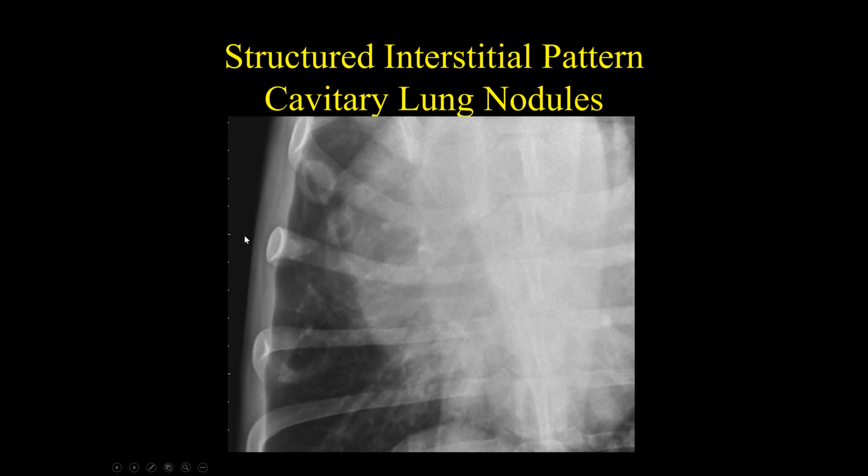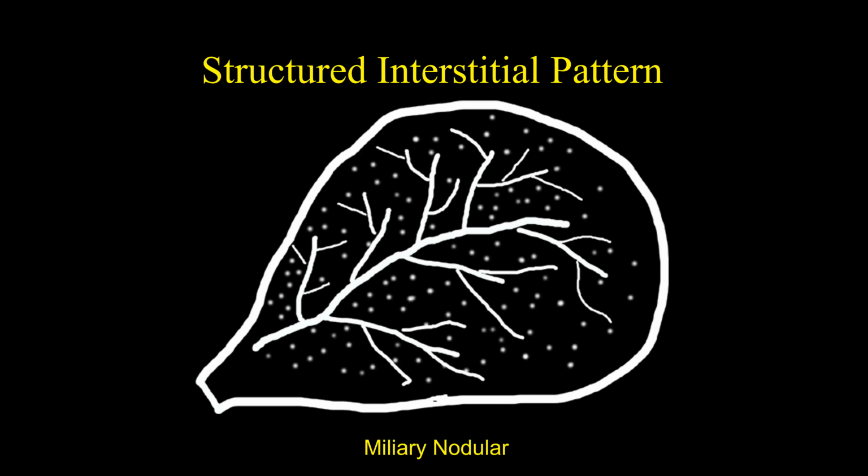Okay. So bottom line is if you see cavitary nodules, they're still variously sized. In an older dog and it's thick-walled, we start thinking, again, cancer. Neoplasia would be your best bet. Sometimes these will be a granuloma or due to parasitic lung disease, but if it's an older dog, again, even if they're cavitary, put neoplasia first on your list.